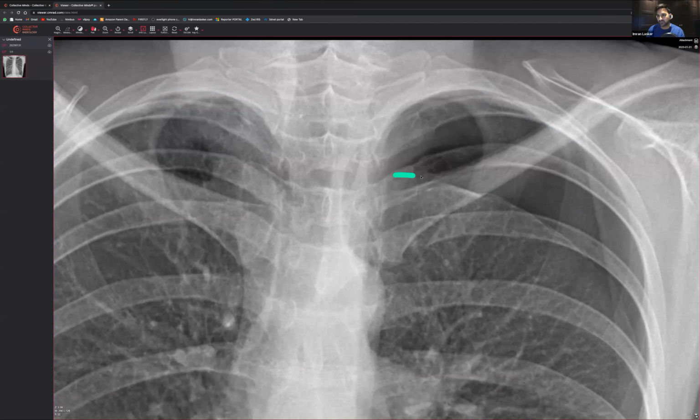And the next part of looking for a pneumothorax is to look for that lung edge. And you can see that there is a lung edge going along like this. It doesn't conform to underlying bone structure at all, and you can definitely see that there is a crisp stop of lung markings to no lung markings. And the reason why I say that's very important is because I've seen situations where you've got someone who's got skin folds, they've lost a lot of weight very, very quickly, they may have underlying malignancy or bariatric surgery, they've got big skin folds, and in those situations people actually end up calling pneumothoraces when there are no pneumothoraces, and go and end up sticking a drain in, which would be not great, would it? So hopefully everyone's seen that is a pneumothorax.